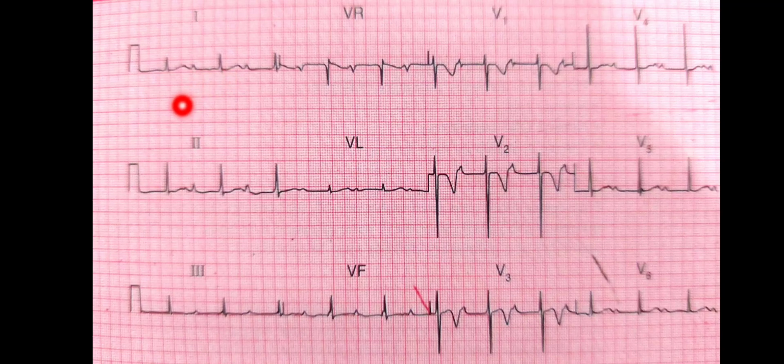And then we start looking at the T waves and the ST segment for elevation or depression. Here, look, we have T wave inversion in V1, V2 and V3, while it's normal in leads V4, V5 and V6. So what is the complete assessment of the ECG? This is first degree block, and most probably, since we are getting it with the T wave inversion, this is non-STEMI.